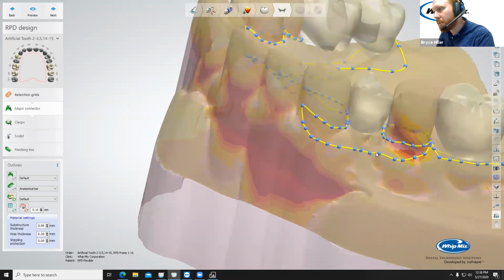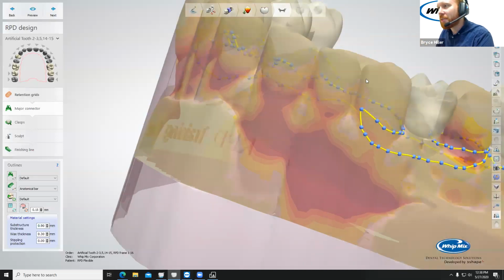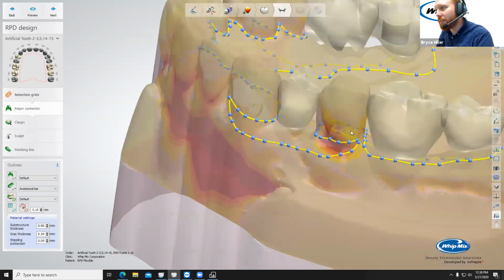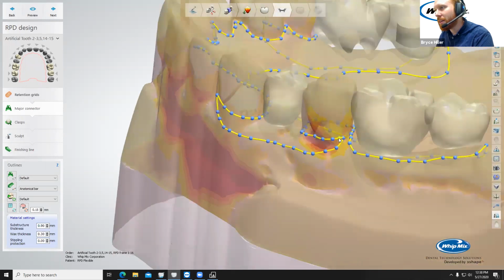Now, one thing that I've noticed that's really challenging, at least for me personally, and Cory, maybe you can attest to this. Everything looks different on screen compared to the final product. I will sit here and nitpick about every little thing that I possibly can find. And then you finish it and you print it or mill it or whatever, and it's like, wow, I never would have even noticed that anyways. So why did I worry about it?